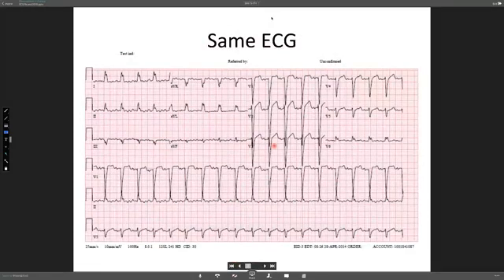So we'll go to the same ECG. You initially get the impression on first look that there are some flutter waves. You could see it mainly in lead 2 and lead 1. But when you focus on the chest leads, you could clearly see a clear P wave, sinus rhythm with left bundle morphology. So this is just P wave. There is no evidence of flutter here.